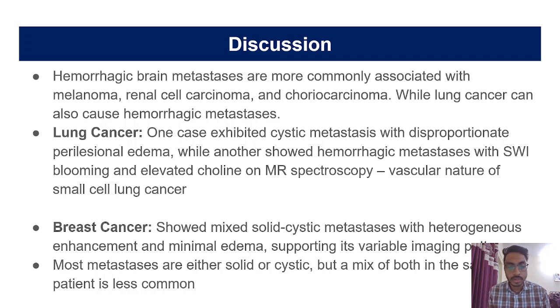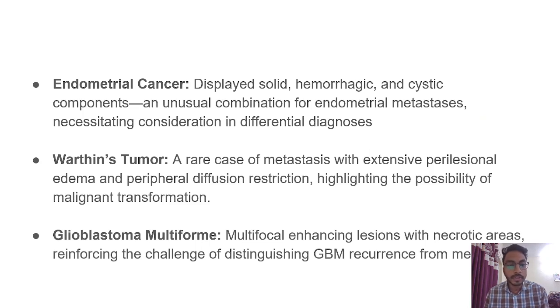Breast cancer showed a mixed solid cystic metastasis with heterogeneous enhancement and minimal edema, supporting its variable imaging patterns. Most metastases are either solid or cystic, but a mix of both in the same patient is less common. Endometrial cancer displayed solid, hemorrhagic and cystic components, an unusual combination for endometrial metastasis, necessitating consideration in differential diagnosis.